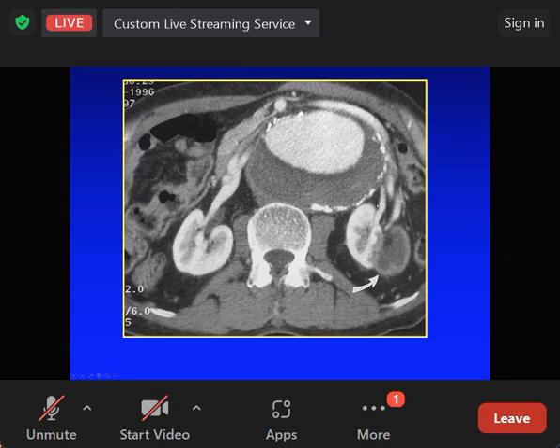This is aorta, isn't it? This is an aortic aneurysm. Here is the lumen containing contrast, but here we've got a lot of darker material, and this is mural thrombus. Remember that the calcification in vessels is normally in the intima because it's calcified endothelium. So this is marking the wall of the aorta. This is within the lumen of the aorta.